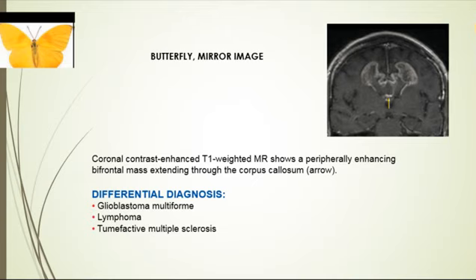Okay? The diffusion will be restricted or not? Restricted. Exactly, the diffusion will be restricted. Tumor hypovascularity is reflected by what enhancement will be? Homogeneous. High or low enhancement, the lymphoma? Rapidly enhancing. Hypovascular tumor. The hypercellular, hypovascular. So the enhancement will be mild to moderate. Homogeneous, but mild to moderate. Okay?